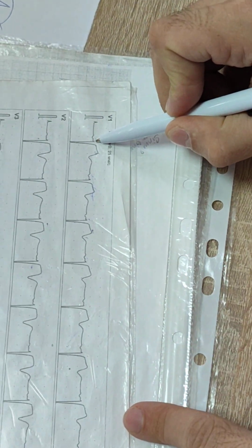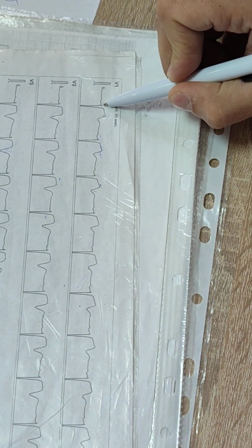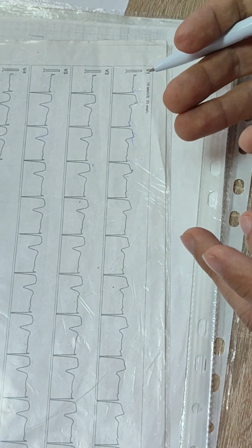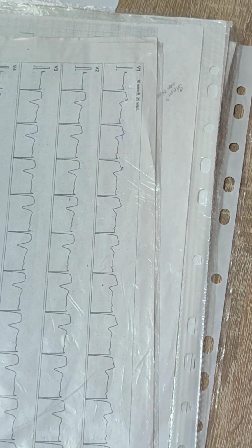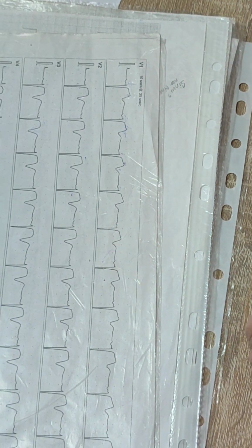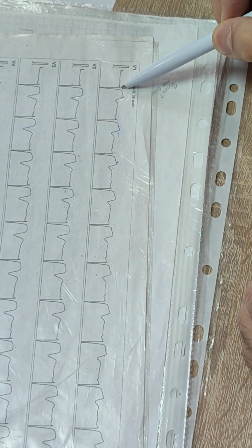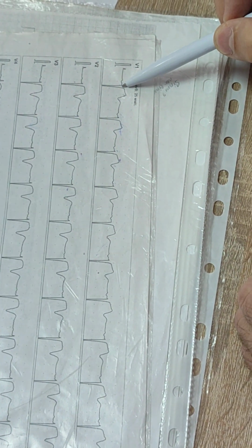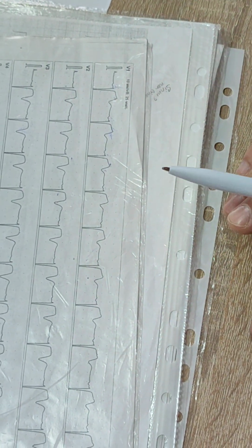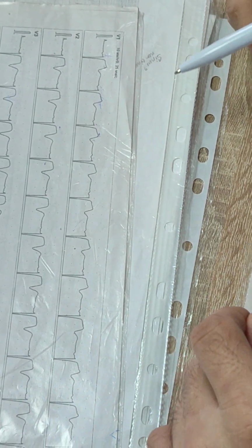R wave is still present. It's very small. A small R wave is one of the criteria of myocardial infarction. But currently we don't know exactly. We need to clarify it. We need to prescribe a troponin test to know if it is myocardial infarction or ischemia. If we wait 1-2 hours, this R wave will disappear and it will be myocardial infarction. Currently it is first stage, super acute stage, if the troponin test is positive.